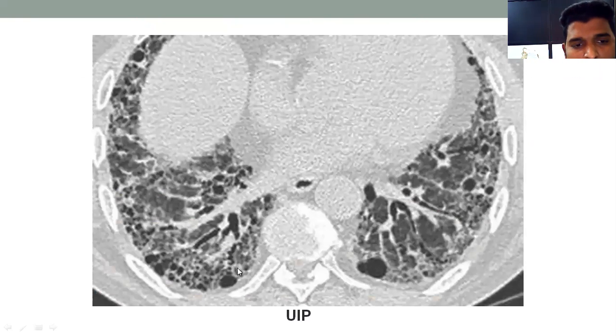This is a patient with IPF. You could see the traction bronchiectasis here. You could see some layers of honeycombing, and there are some bizarre cysts like this. These cysts are not typical of honeycombing. As the disease is progressive, you could see the coalescence of honeycombing give some form of larger cyst, which is not very typical of a honeycomb cyst, but you may get this type of cyst in some patients who have a progressive disease.